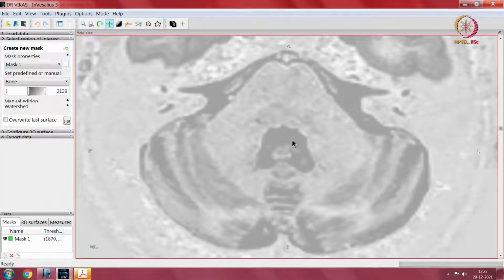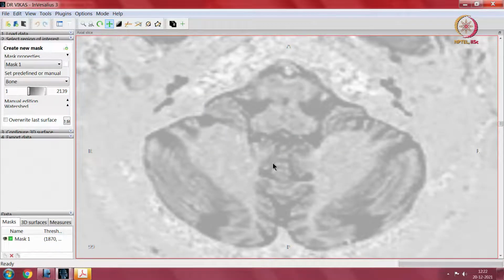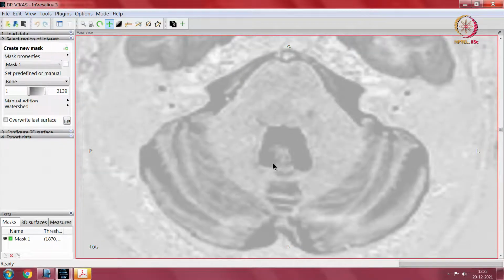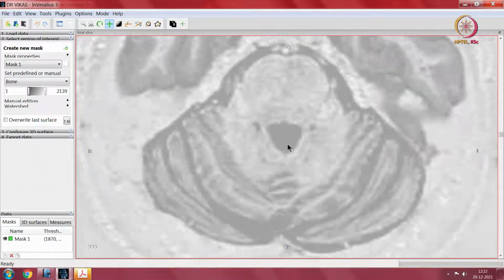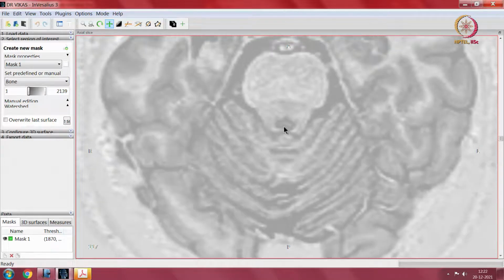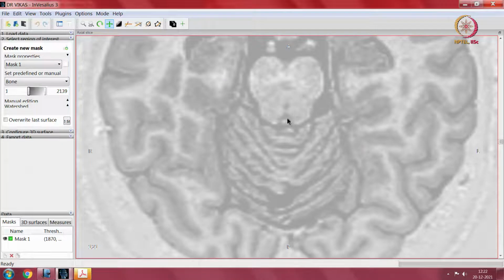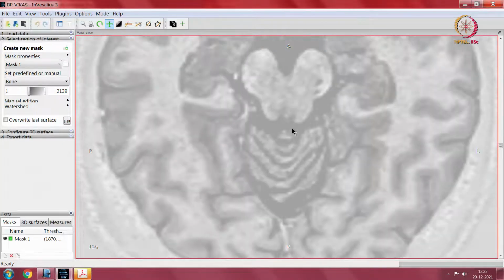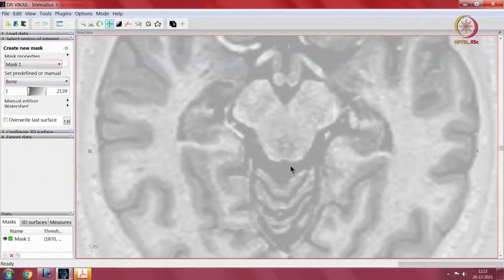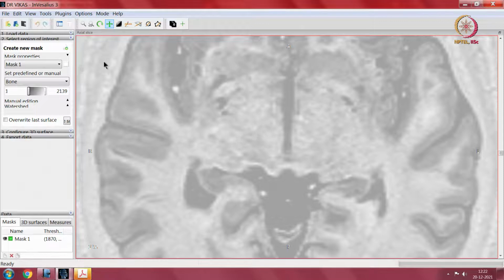Another structure seen black in color. So, this thing is the ventricle. Which ventricle would it be? It would be the fourth ventricle, because we are starting from the base and coming up. So, that is the fourth ventricle. What happens to the fourth ventricle? We trace it up and just above you see that it becomes a small cavity over here, it is called the aqueduct. Right.